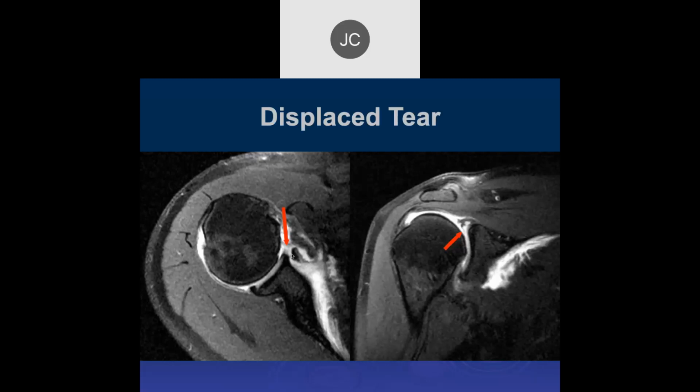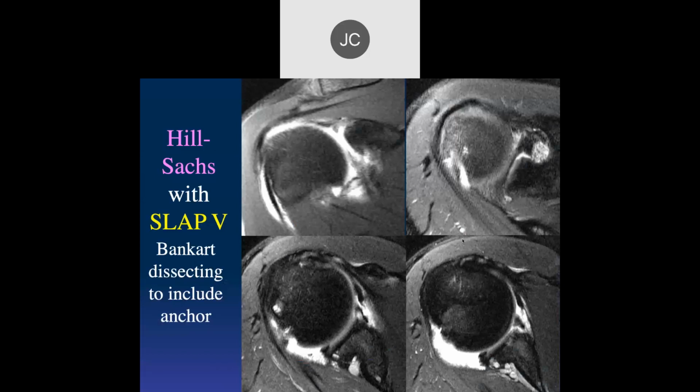But if you work with people who like the SLAP designation, though I think it's much less common now than it was 20 years ago to use the term SLAP, because a lot of these more complicated SLAPs were kind of shoehorned in with Snyder's designation, when in reality they're really a different mechanism of injury. So I think the location and what's happening is more important than the type of SLAP it is.